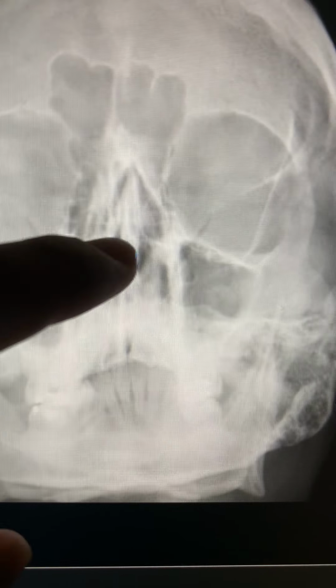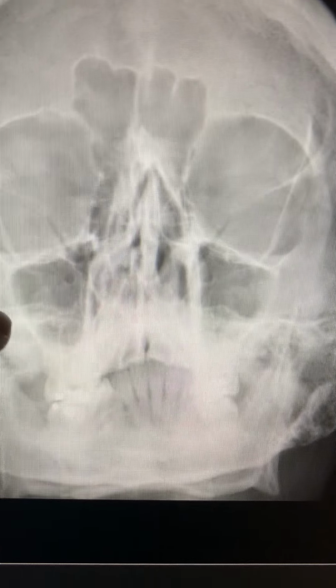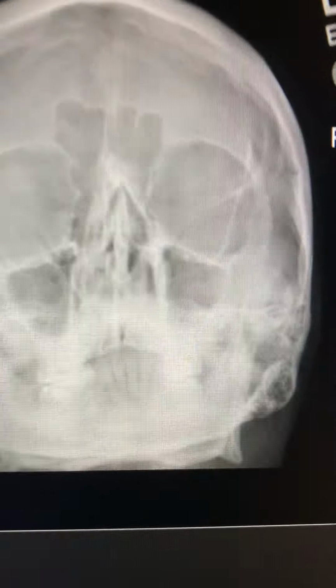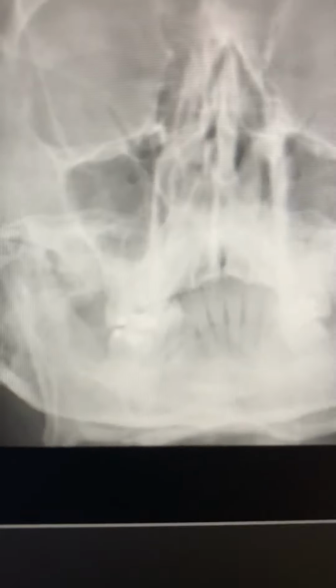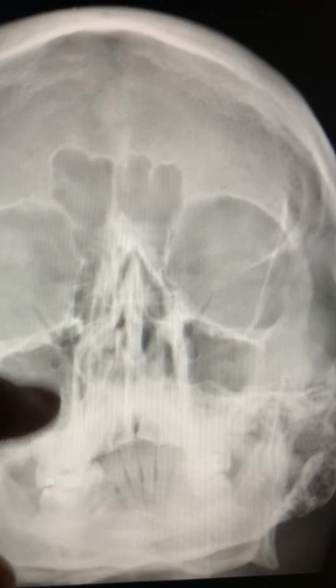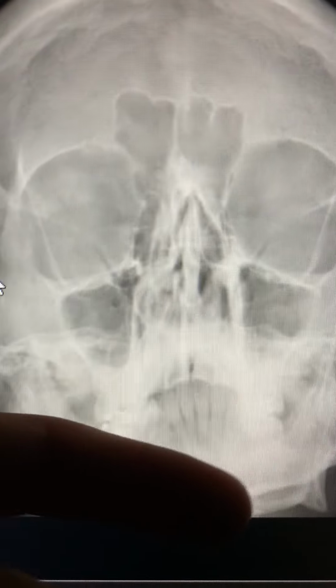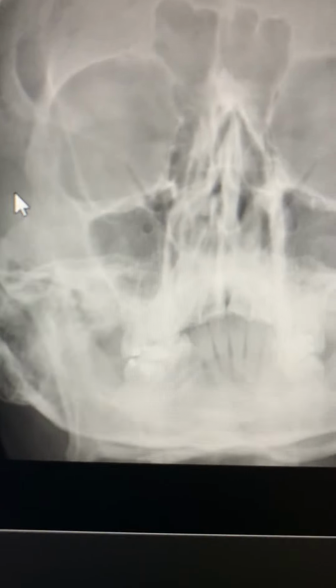We can see the ethmoid sinuses here, the maxillary sinuses. The only problem that would warrant a repeat, but it was okay, we can see the mastoid tips, but if this image were to be repeated, I would make sure to tilt the chin up on the patient just a bit more, because the maxillary sinuses aren't completely above the petrous ridges, but they are very clearly pictured.